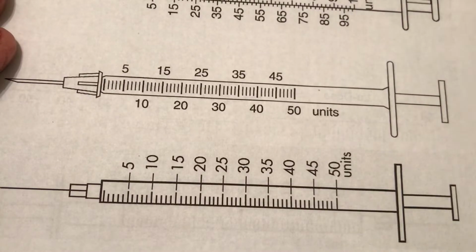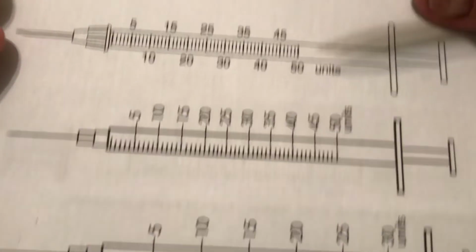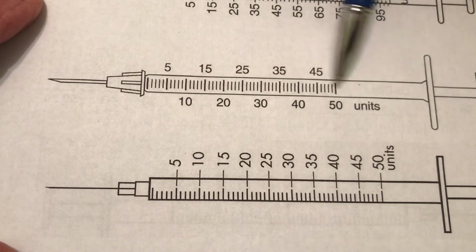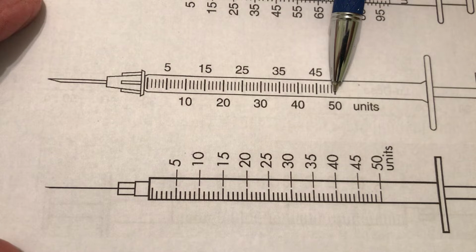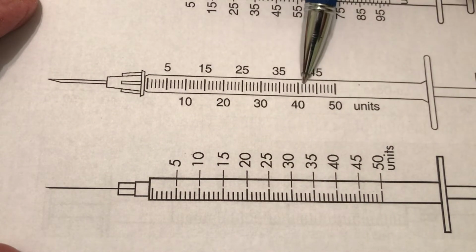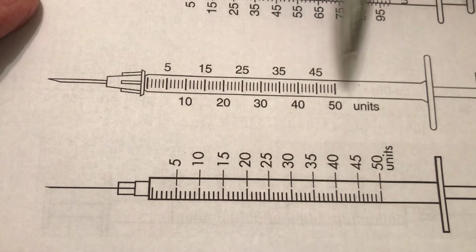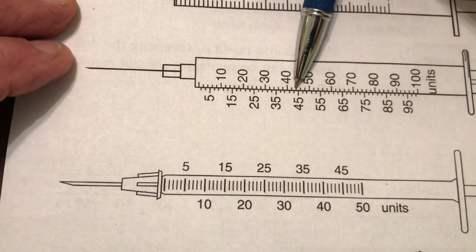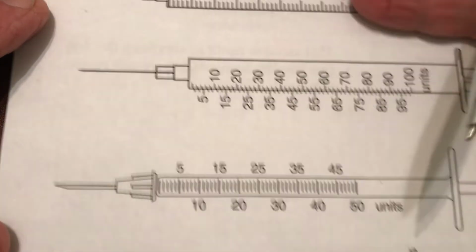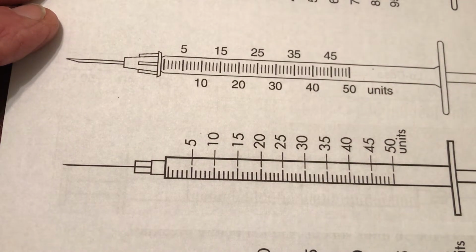Well, look here, though. These next two are called low-dose insulin syringes. Well, there's 3 of them here. They hold less than 100. This one holds 50. Now a big difference here. 5, 10, 15, 20, etc. So if you go 2 marks past the 40 on here, that's 42. Whereas 2 marks past the 40 here is 44, because they're marked in different ways.